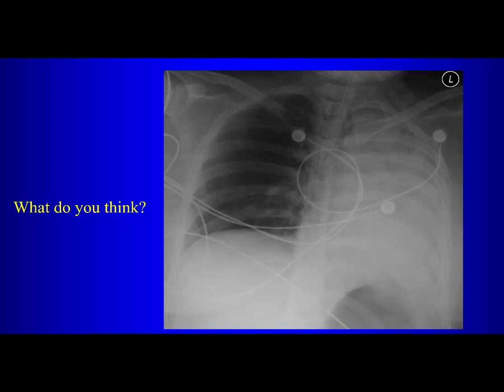ARDS. No, ARDS is bilateral. No. Yes, so atelectasis. Complete lung atelectasis versus large pleural effusion. Those are the two things you have to decide between when you have a case of whiteout. So how do you decide which it is?